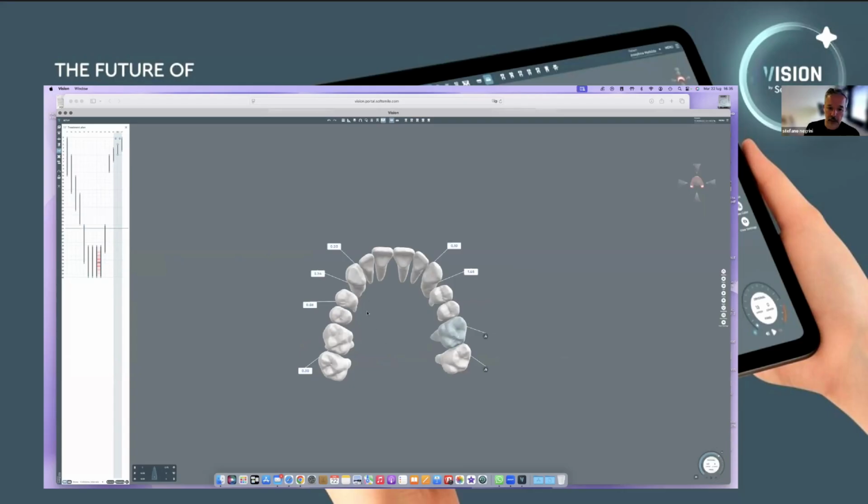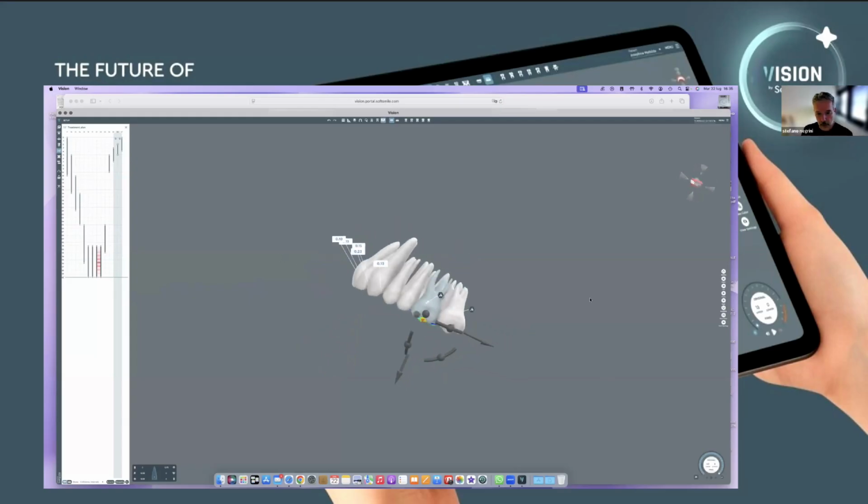At the end, when I finish this one, I don't move all of the teeth at the same time, but just the canine for the first movement. And at the end, maybe when the canine is almost ready, I move the others too. It's not exactly the same, the staging, but it's almost the same. I can move the canine first because if you move the six at the same time, probably you lose some of the distalization movement, and that is not so good. And when the canine is also at the end, it's possible to adjust the incisors.